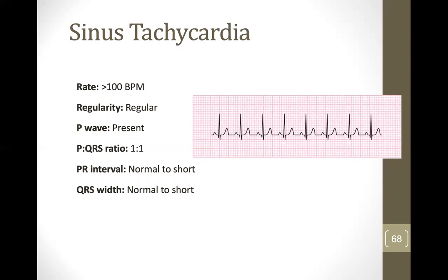It's coming from the sinus, from the SA node, and it is a fast heart rate because it'd be around 140 beats per minute.